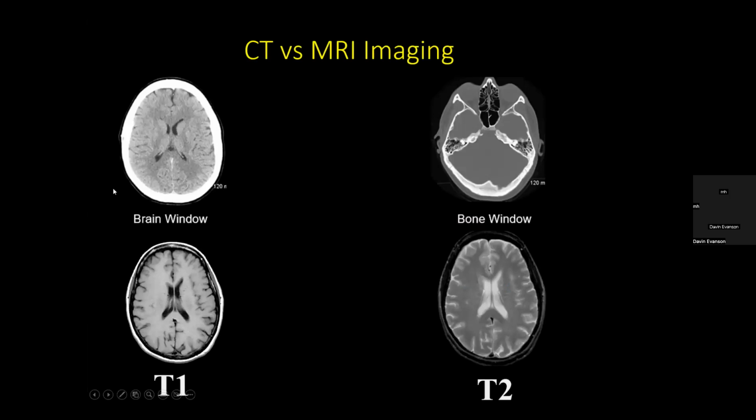Here's the image I was talking about. Here is a CT. Note the bones are bright. This is on the bone window. We talked about the different leveling. On MRI, the bones are definitely dark here, hypointense. CSF is bright. That's our T2. And here you just have to realize that's the bone, so it's dark. It's MRI. The ventricles are dark. This will work 90% of the time.